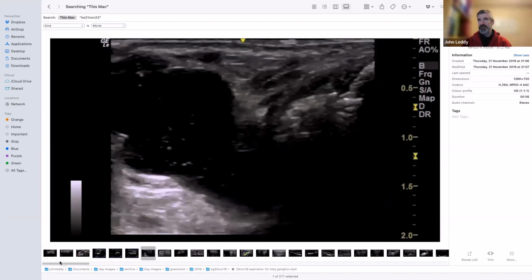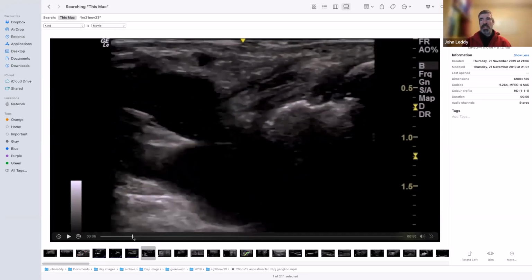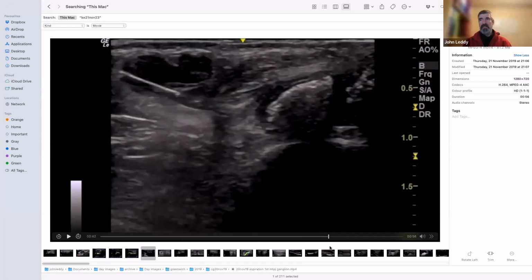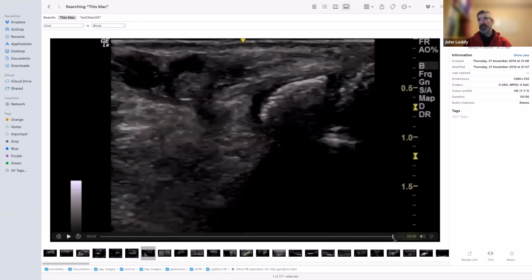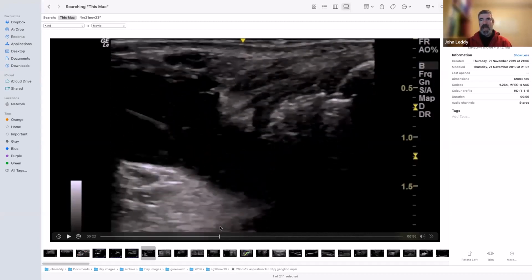I will say that it resembles that, and I will say that the images are not specific, but this resembles a sealed off pseudoaneurysm. Where does that go? That would probably go off to a vascular surgeon just to make sure, for an opinion. I gotcha.